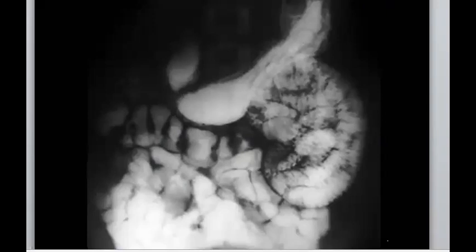Let's have this case. What is this important case for? This is jejunum, and I agree with you that the colon maybe is not in its location. One of the important differentials to mention is that it could be internal hernia. Asil, welcome back. I just see your name now. Okay, Asil. So internal hernia, one of the good differentials.